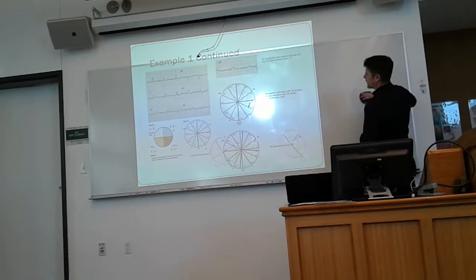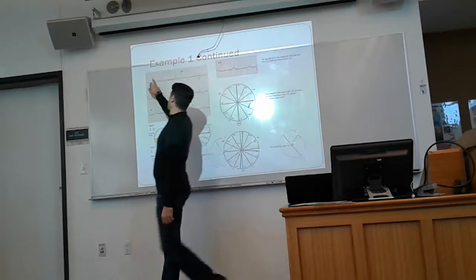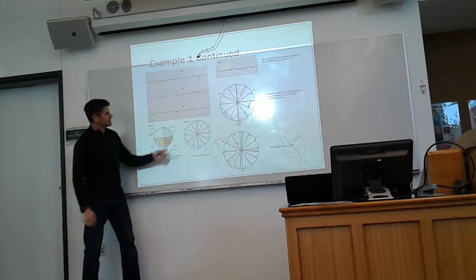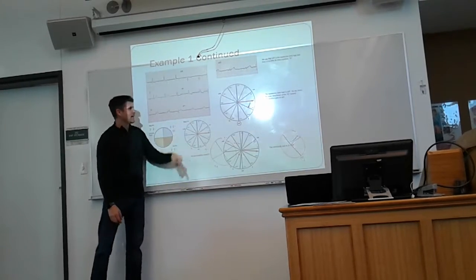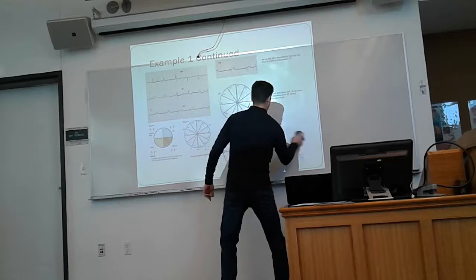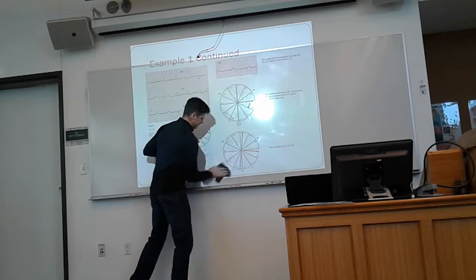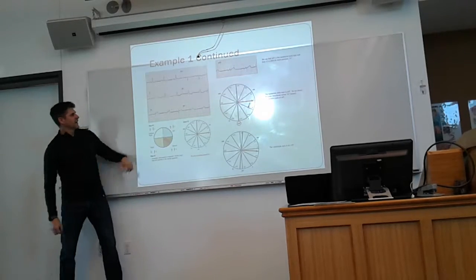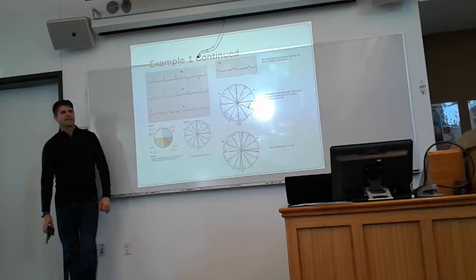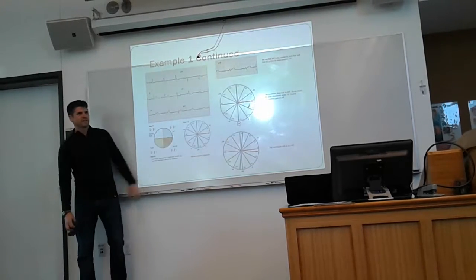This was looking at the very first example that we looked at a minute ago. So lead 1 was positive, and AVF was biphasic, and slightly more positive than negative, but we'll see exactly what it's going to be. As we're measuring, it's maybe a box more positive than it is negative on the AVF side. So we know we're in the normal quadrant.